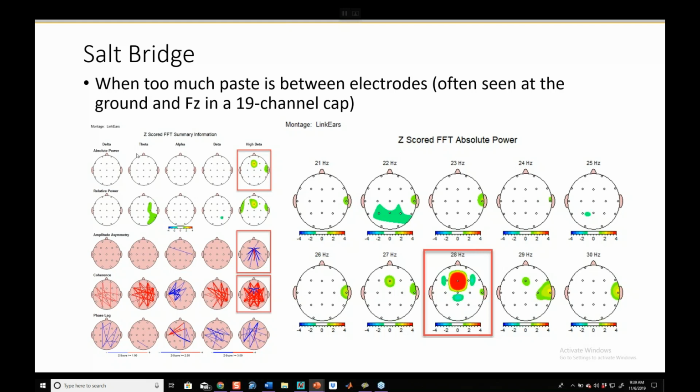And the subharmonic of electricity on a 60 hertz grid, like we have in America, is going to be 28 hertz. And 28 hertz has to do with the difference in the grid itself and the sampling rate. In this case, it's 256. So it's also called the alias, right?